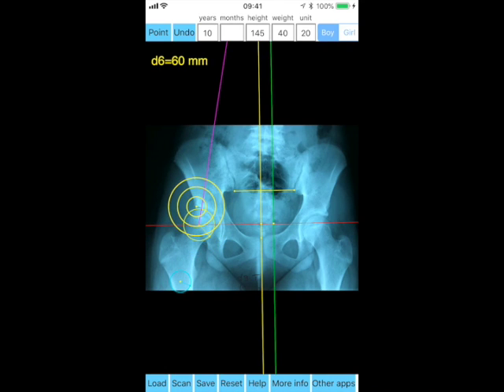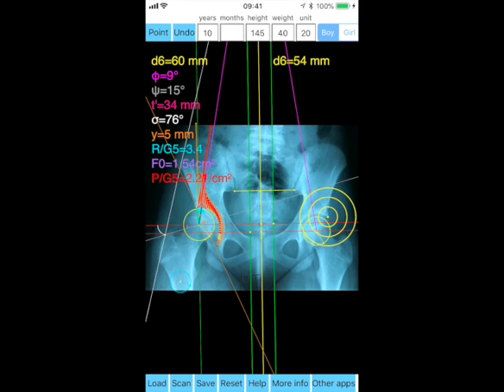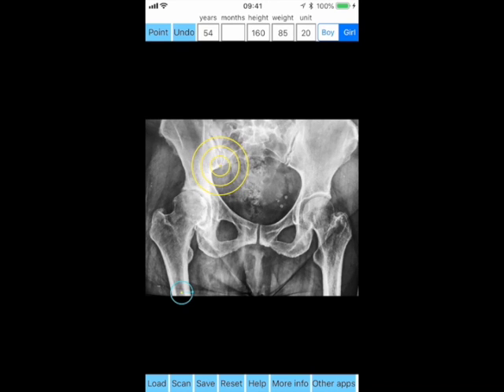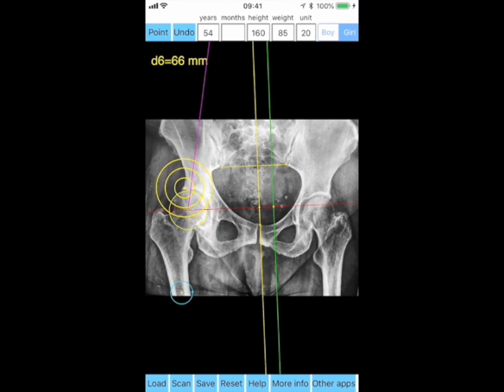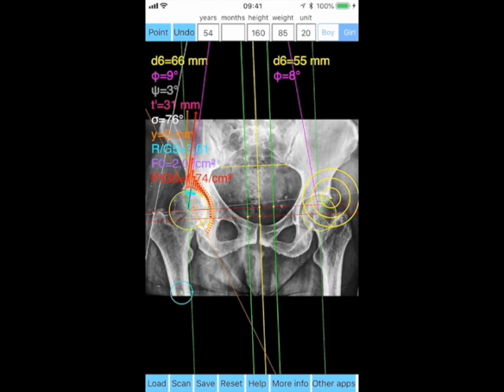S3, lateral edge of the superior end plate of the S1 vertebra, left; S4, lateral edge of the superior end plate of the S1 vertebra, right. S5, center of upper middle distance of pubic symphysis, right side. C6, femoral head center; R7, dynamic circle radius of femoral head; E8, lateral acetabular margin of acetabulum; A9, deepest point of the acetabulum or the triradiate cartilage; V10, the acetabular teardrop; D11, femoral head intersection at the posterior-inferior acetabular margin; T12, insertion of the hip abductors on the greater trochanter, left side.